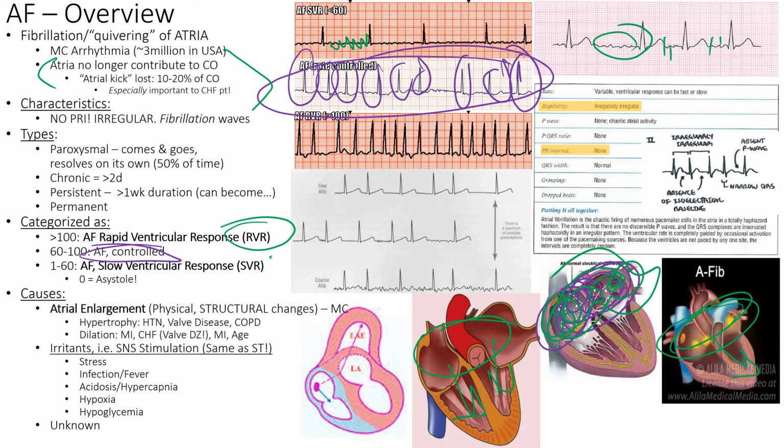And what causes AFib is someone's atria that are messed up. They have scar tissue. They have a big atria. So this patient has left atrial enlargement, right? So this guy is trying to depolarize the AV node, but then this guy's away from me, and away from me, away from me, away from me. And now you have 5 different ectopic sites, and now you have AFib on your hands, right? This person is not going to be paroxysmal. That's not something you can fix right away, right?